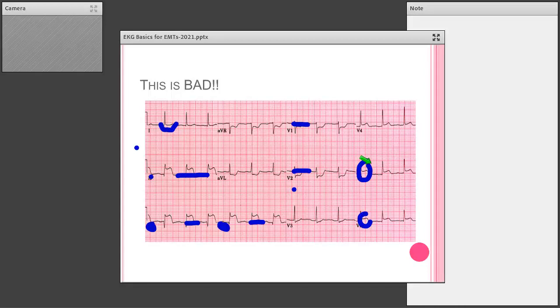If you take them to a hospital without a cath lab, they're going to get sent to one with a cath lab. So part of your care is determining the appropriate destination for the patient, and that comes with wherever you happen to be practicing with the resources available to you. So the monitor interpretation for this would likely say something like acute inferior wall MI.